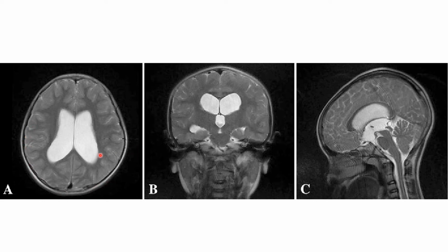Okay, so we have enlarged lateral ventricles, an enlarged right lateral ventricle and left lateral ventricle, and a dilated third ventricle here. Here, if we look at the fourth ventricle, it's not dilated. So most likely the obstruction is here in the aqueduct of Sylvius, causing obstruction of the pathway of the CSF to the fourth ventricle, causing triventricular hydrocephalus.